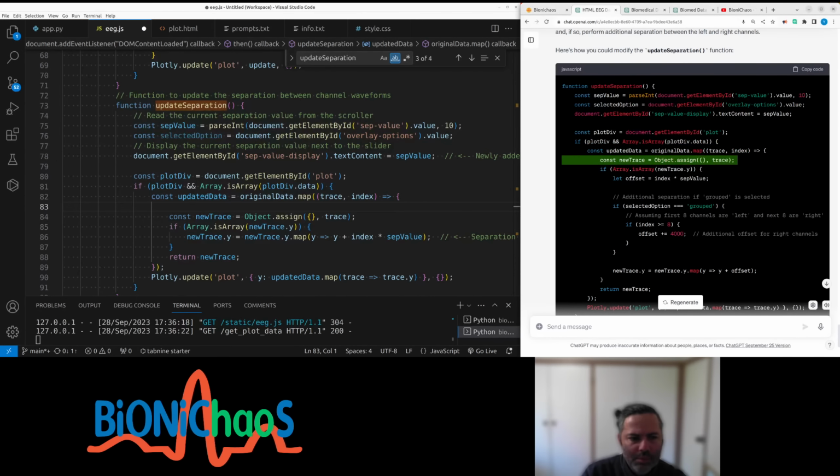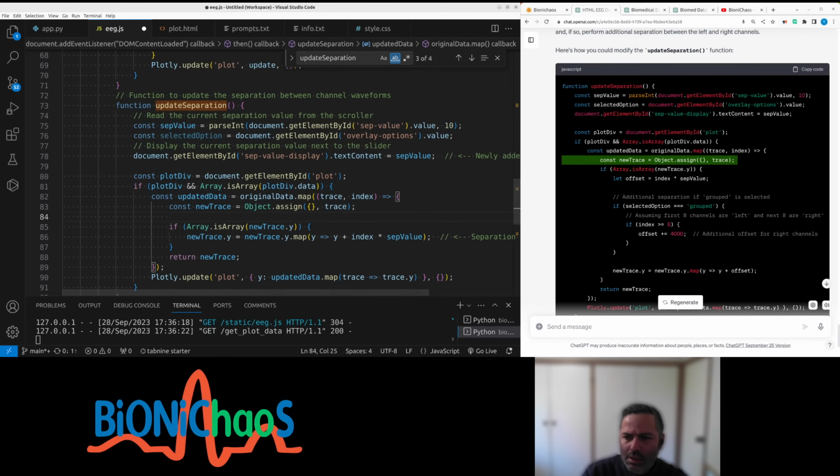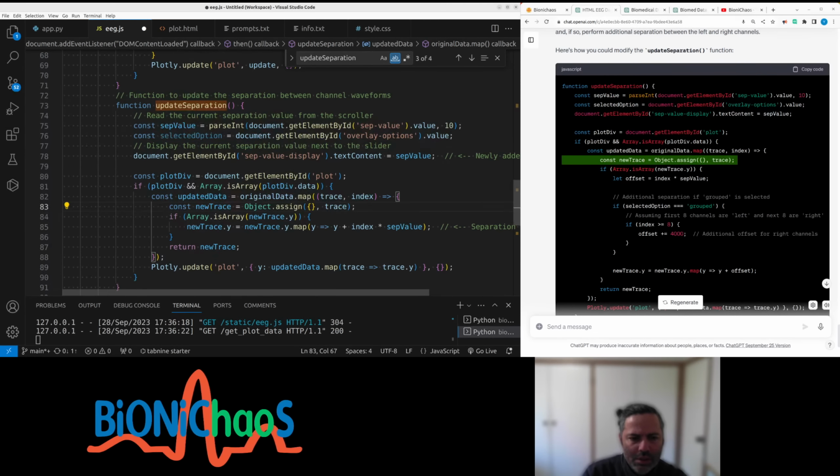The same. Have new trace assign. It's the same. If array new trace, let. Okay, this is different.